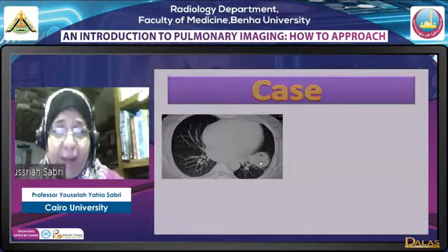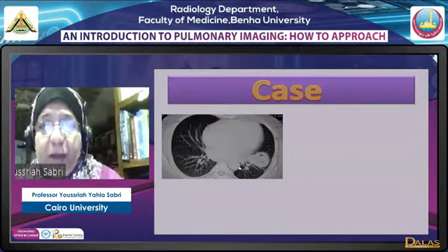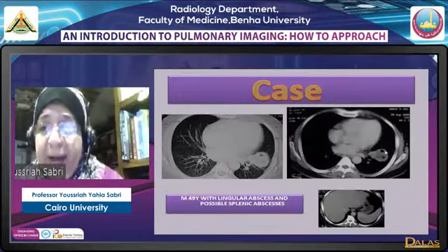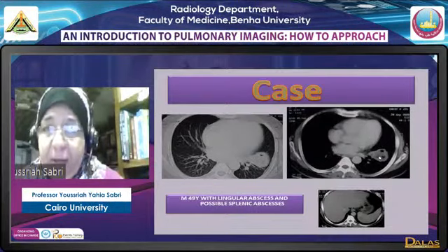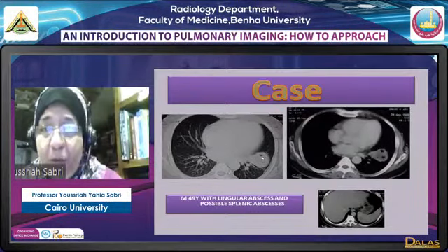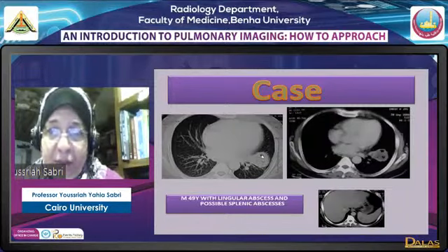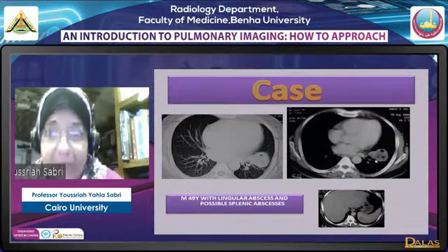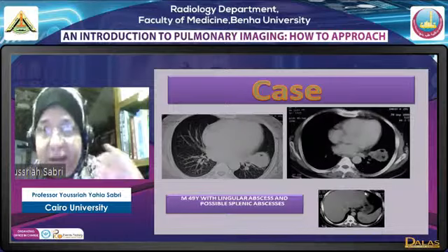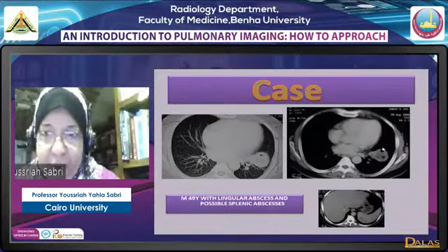Am I dealing with bronchogenic carcinoma? What must I do? Do a mediastinal window. When we do the mediastinal window, we find that the lumen had fluid and air locules. So the lumen actually is central, not eccentric. The only thing that was apparent in the lung window was the locule, so it gave the misunderstanding that we are dealing with an eccentric lumen. However, it is totally central with a totally uniform wall. This is an abscess. So, to strengthen again, it's very important to see the mediastinal window for tissue characterization.